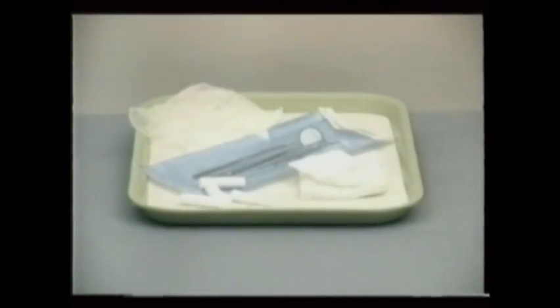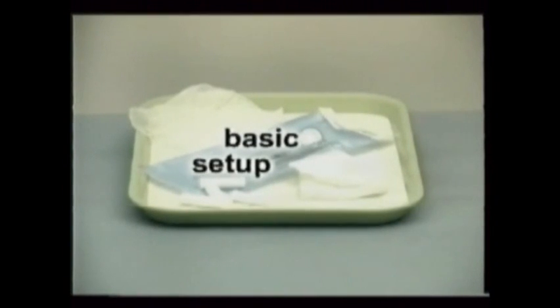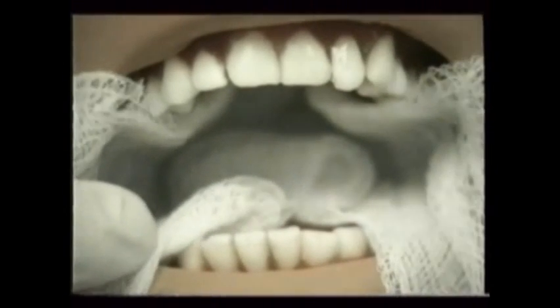As mentioned, oral surgery procedures use some instruments and techniques based in general dentistry. There are additional items needed that guarantee surgery patients receive proper care. As with all dental procedures, a basic dental setup is included in the oral surgery setup. Extra paper goods are also used, including cotton rolls and gauze to help control bleeding. The doctor may use an opened 4x4 sheet of gauze as a throat pack, lightly draped behind the teeth. This prevents a patient from accidentally swallowing or inhaling a foreign object.